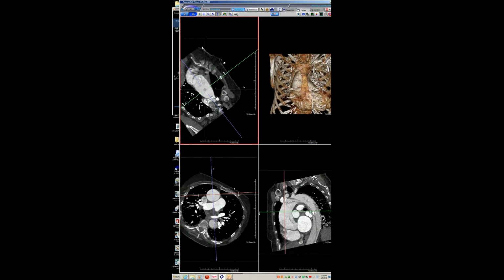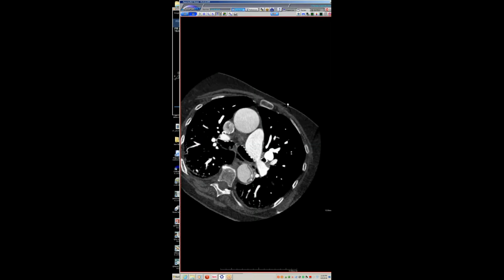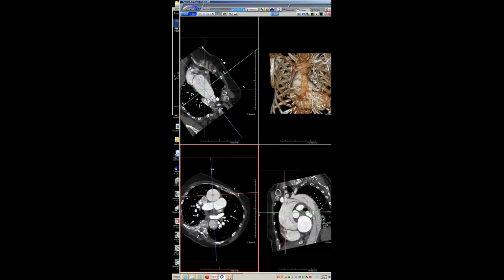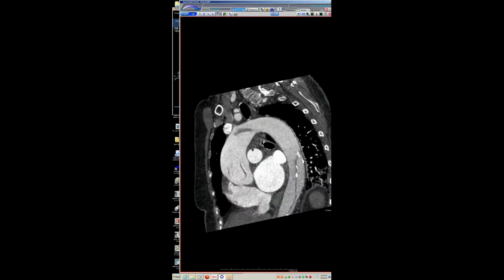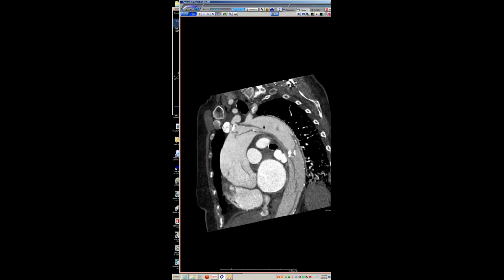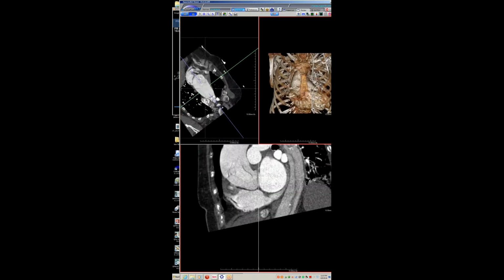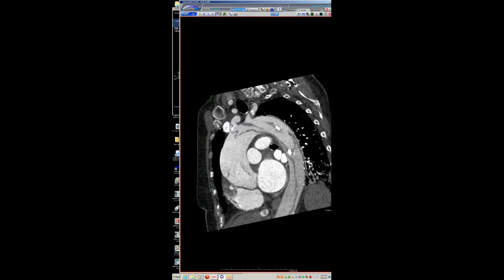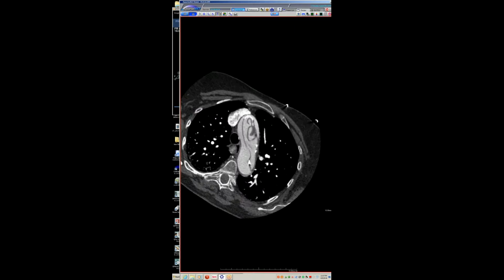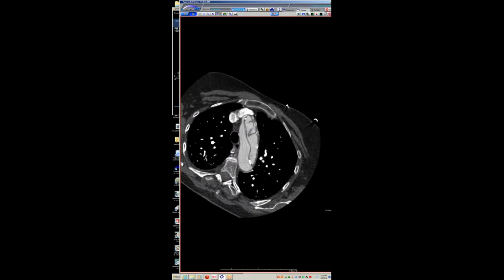Is that an actual sign? I've never even heard of that, but. Yeah, that's a description. So if you have a circumferential tear, the proximal tear is in the bottom, and some of it may go back into the ventricle in diastole. Yeah. And the other tear goes distally along the direction of blood flow. The space between the two flaps right there is the empty ascending aorta. So you're saying, okay, so you're saying that here it is. So that's the balled up other portion then. Yeah, the other portion goes in the direction of blood flow.